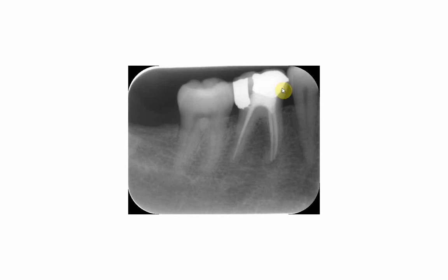Anyways, this is an amalgam filling, and just underneath it you can see a material which has a relatively higher radio opacity than the gutta percha filling. This material is mostly the temporary filling that has been left over, part of it, the zinc oxide eugenol. Usually it is an interim material placed in between fillings or before the final filling.